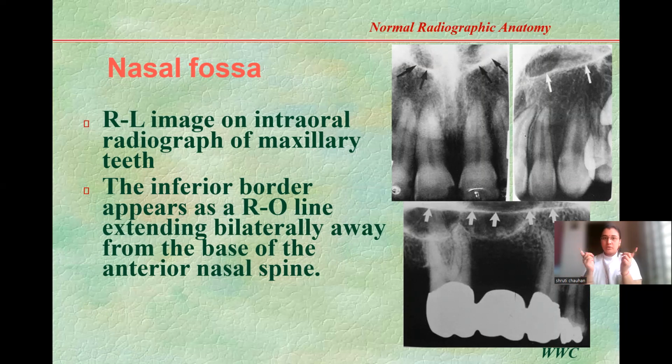So the inferior border of the nasal fossa appears as a radio-opaque line extending bilaterally from the base of the anterior nasal spine. Did you get this?